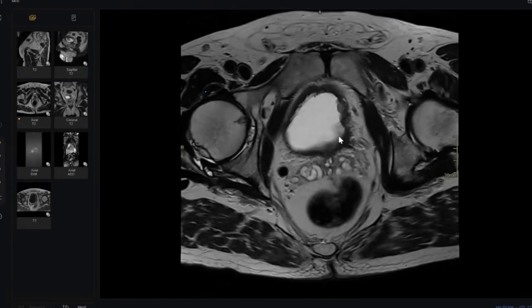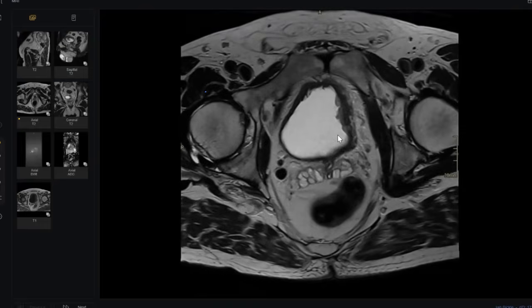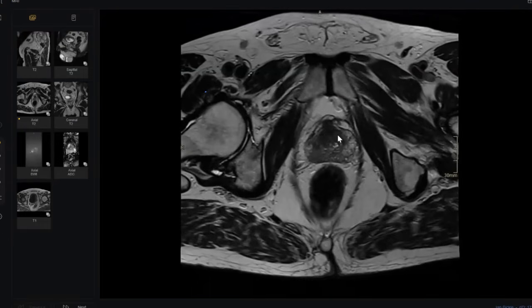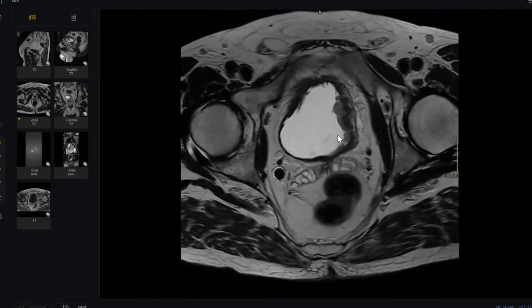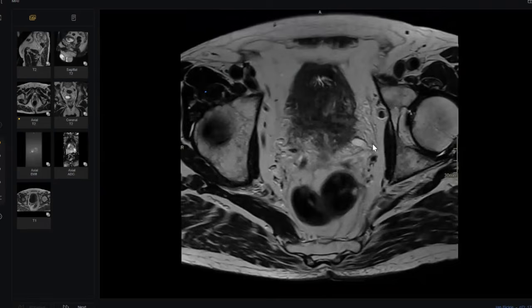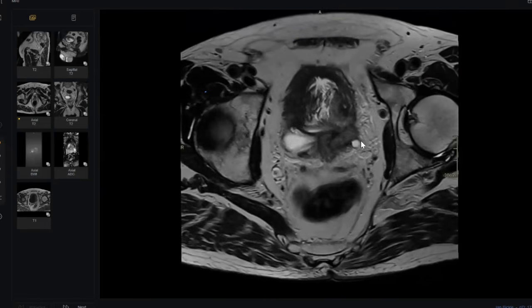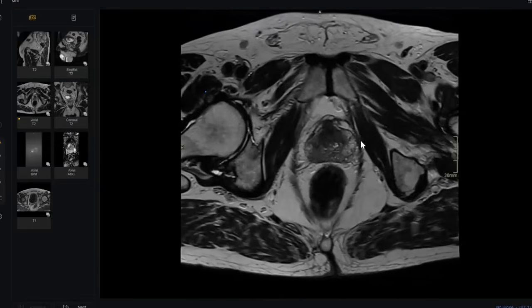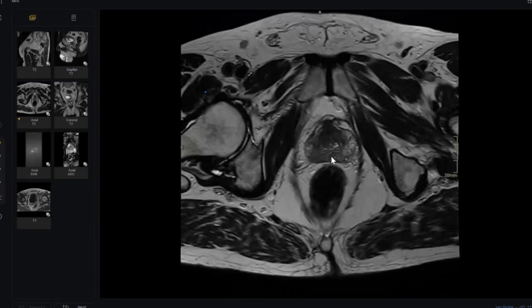And okay, she picked up some extraluminal extension maybe here. Very, very acceptable. But what about this one? Very important. If you miss telling the examiner, okay, doctor, there is maybe some extraluminal extension and subsequent left hydroureter, but don't forget this one. This is very, very important. Don't miss this one. What happened here?